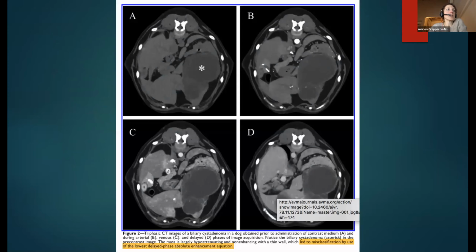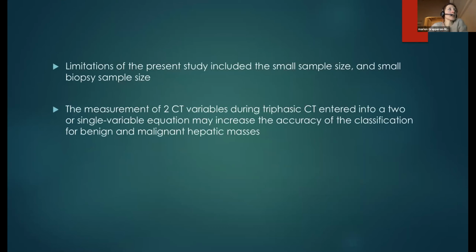Yes, this was the case of the biliary cystadenoma. It looks a little bit less heterogeneous than a hepatocellular carcinoma, but you have this large area of fluid accumulation.